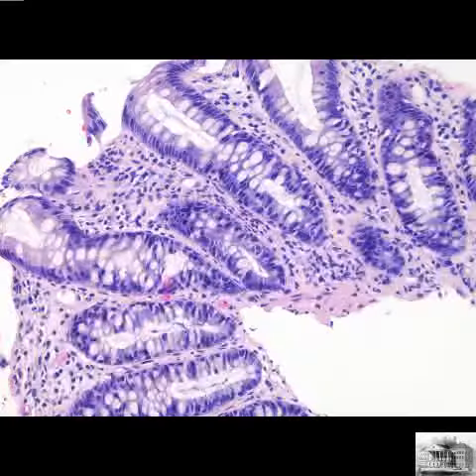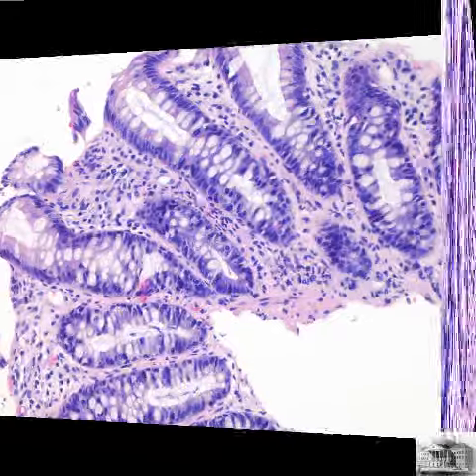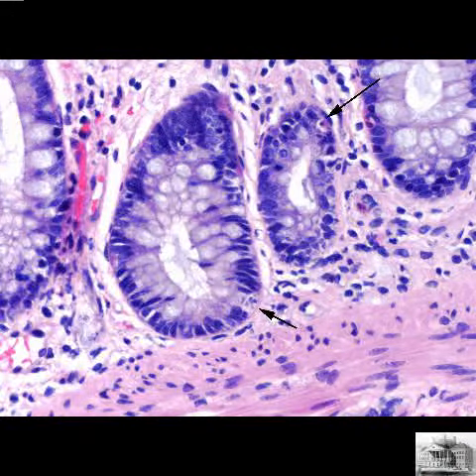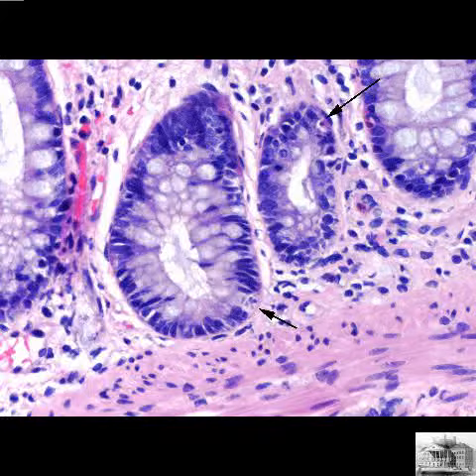Subsequent biopsies were performed. The colonic mucosa appears injured and regenerative, with large growing nuclei extending high up the crypts towards the surface. Higher power shows nuclear fragmentation or apoptotic bodies, as shown by the arrows, characteristic of graft versus host disease.